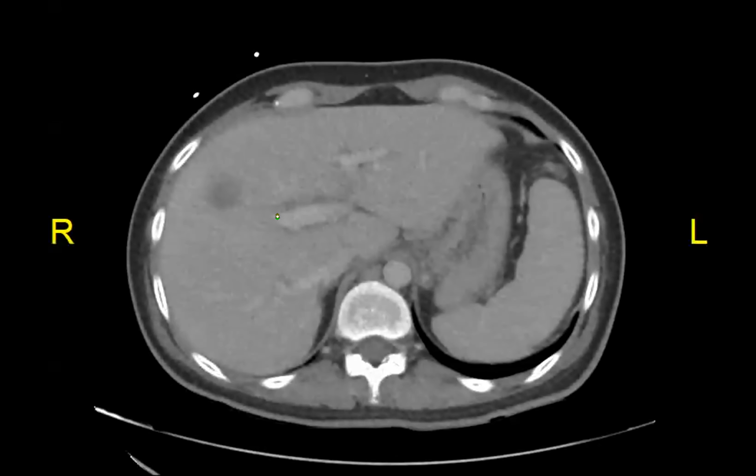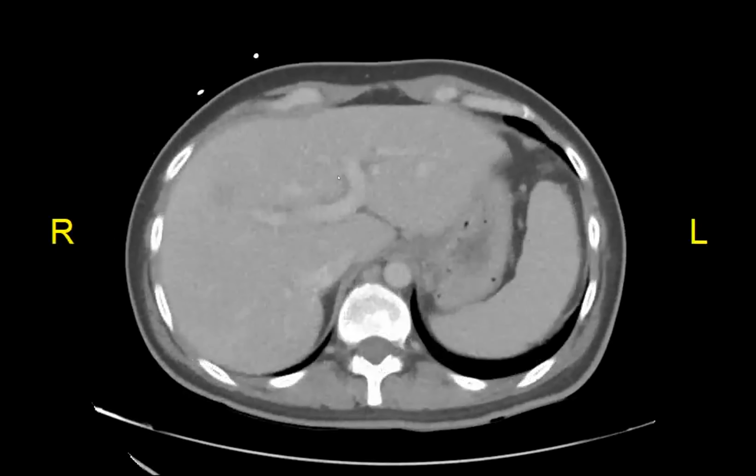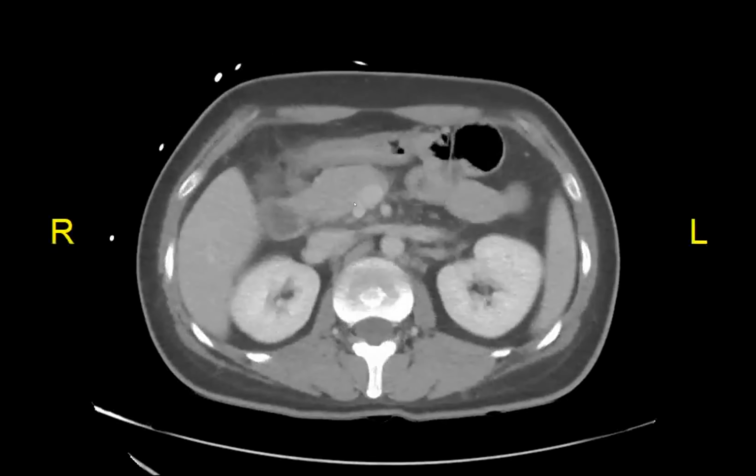Kind of cautionary tales, and one is a really crazy case. Okay. So this is a 27-year-old man, and the age is important, who came in to an outside hospital with abdominal pain and just non-specific, feverish symptoms. Then they thought he had acute cholecystitis. They put in a cholecystostomy tube, and then he was not getting better, so they rescanned him. Can you see my screen okay?